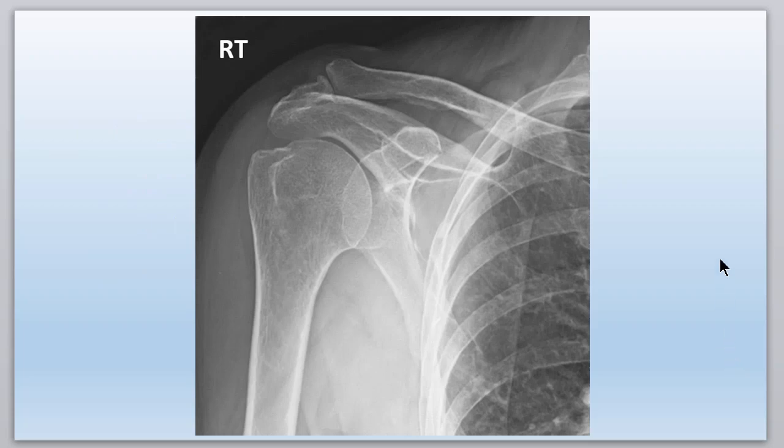All right, so here's a radiograph of the shoulder, A to P, or from front to back. So first thing we can see here is the clavicle, which you can see right here. The clavicle meets this structure, which is the acromial process of the, don't forget to say of the scapula. This makes a very important joint right here. This is the AC joint, or acromial clavicular joint. We'll talk about the ligaments that hold that together in a little while.